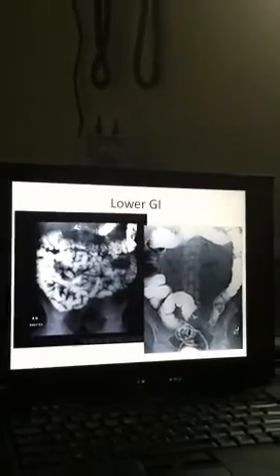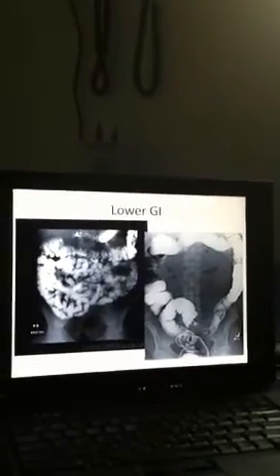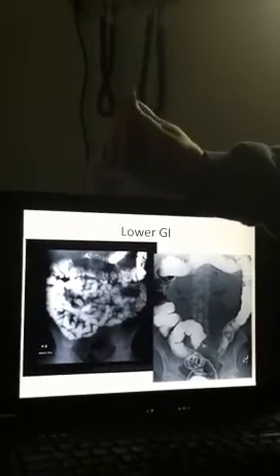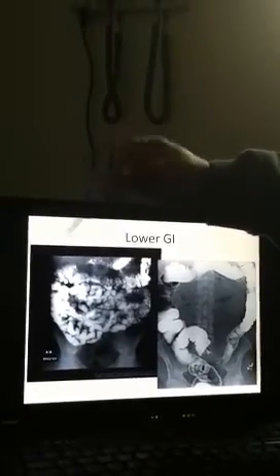This patient is full of feces, and that's what you're seeing. Yeah. All those thumbprint signs. It happens a lot. Patients come into the ER with abdominal pain. Most of the time they're constipated, so. Especially in the elderly. Oh, yeah. Drug users, narcotics. I had a med student think she had appendicitis, and she was just constipated.